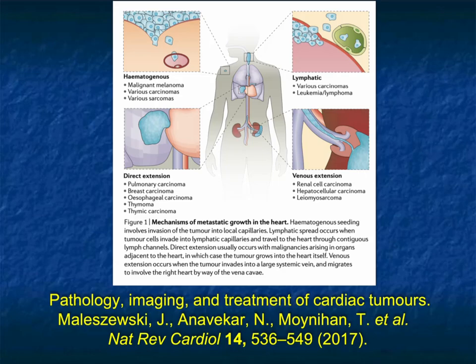When you do see it, it's typically due to extension along the venous structures, and you can follow it growing into a cardiac chamber. But an isolated mass, think about how we expect a myxoma to look, is not going to be a very common appearance for metastatic disease.